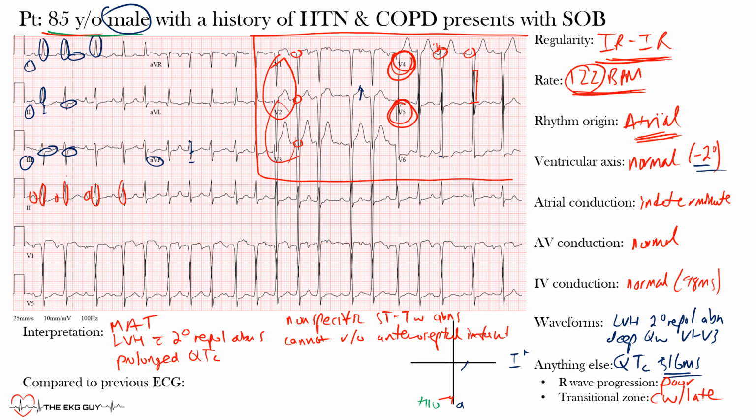All right, and then when we looked at the previous ECG, those were actually there, which is reassuring, okay, and the only thing we saw is that sinus rhythm is no longer present. So sinus rhythm no longer present, replaced with this multifocal atrial tachycardia. Okay, so that's the rhythm that's replaced it.